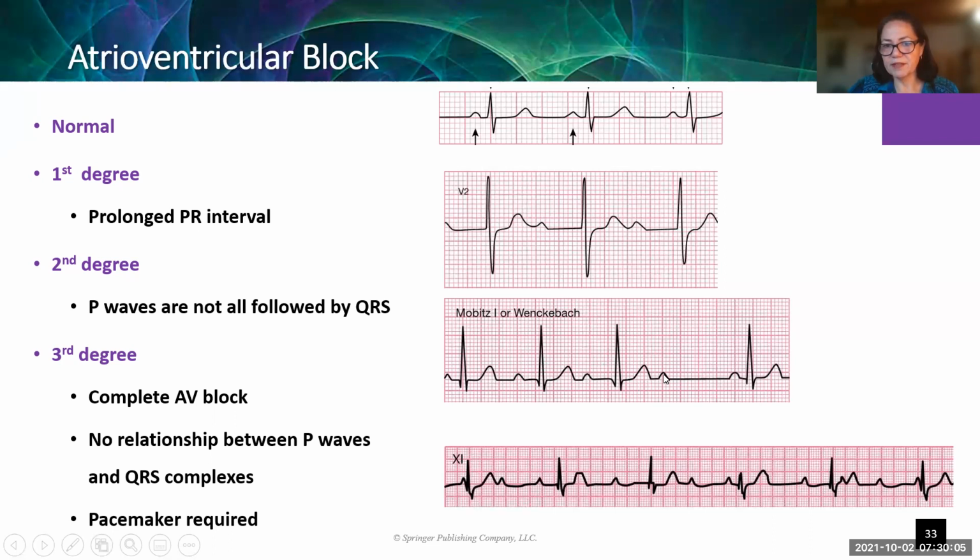Here's a P wave. Nothing. There's the next P wave. And so that's what we mean by not all the P waves are followed by a QRS complex. This can get extra bad, in which case there may need to be an intervention.